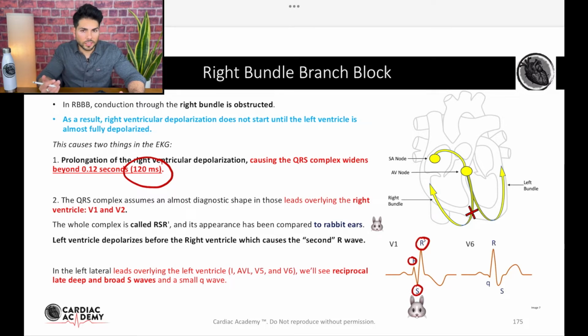Additionally, you look at V6. And V6 is the left portion of the heart, right? Remember that the left leads are lead 1, AVL, V5, and V6. They see the left portion of the heart, okay? As we see here, you're going to see a wide S wave. You can see that right here. But the most important thing you should look for is that positive deflection in V1 with a widened QRS complex, okay? The rabbit ears also help, but they're not always there, but it's good to look for them, okay?